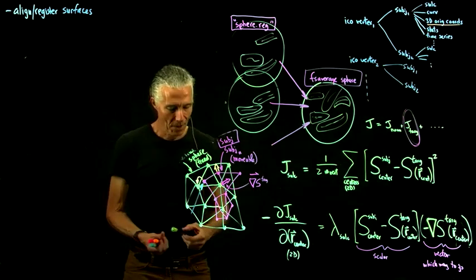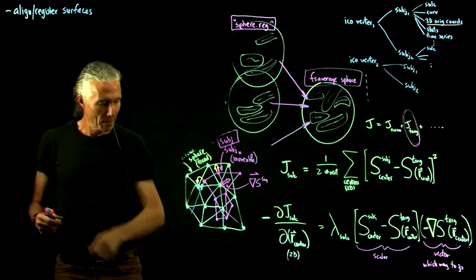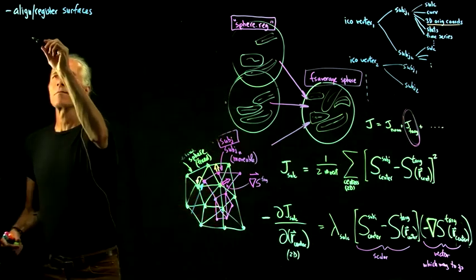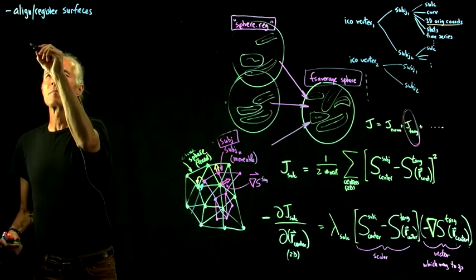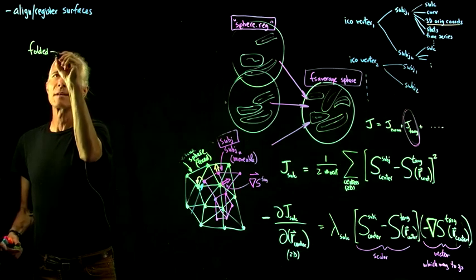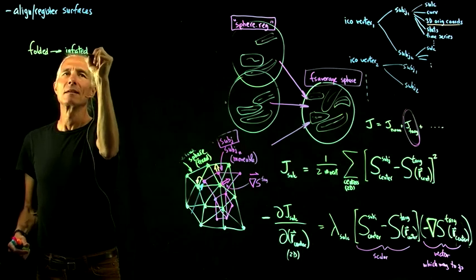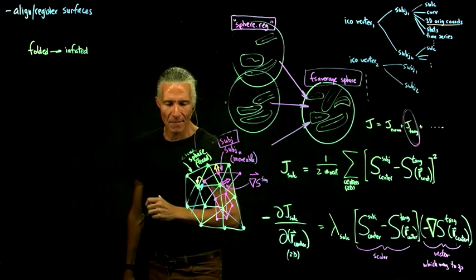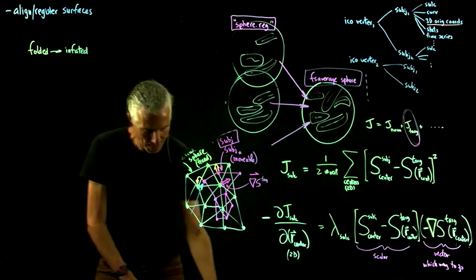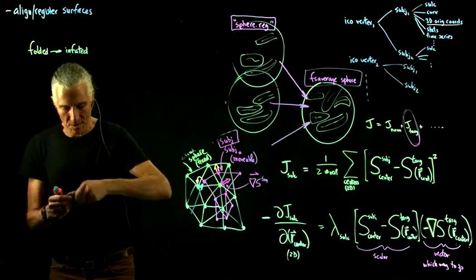And so if you do that, how does that work? You go from a folded individual brain to an inflated one.